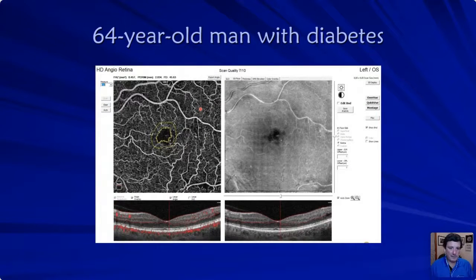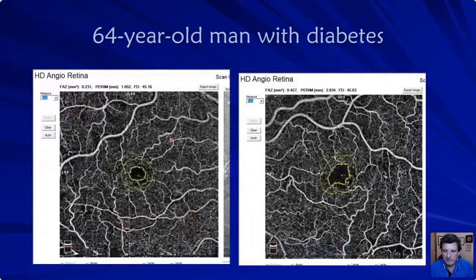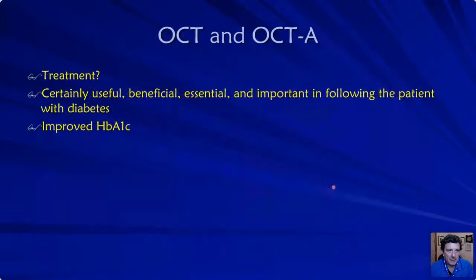Look at that foveal avascular zone on this patient. Look how distorted this is. You can see this exudated blood, how it's matching perfectly with what's happening to this foveal avascular zone. Never a day goes by that we don't have fun being a geek with our angiography in the practice. And again, you can see here microaneurysm formation, dropout that's out there.